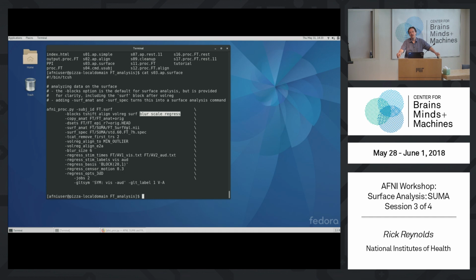You can choose 8 millimeters. You can choose a thickness, but only in a case where you wouldn't really want to. The thing is, you have 2 surfaces. You can say make it 20% bigger this way, 30% bigger this way, or go in, or whatever you want to. Or you can say a millimeter this way, a millimeter this way.